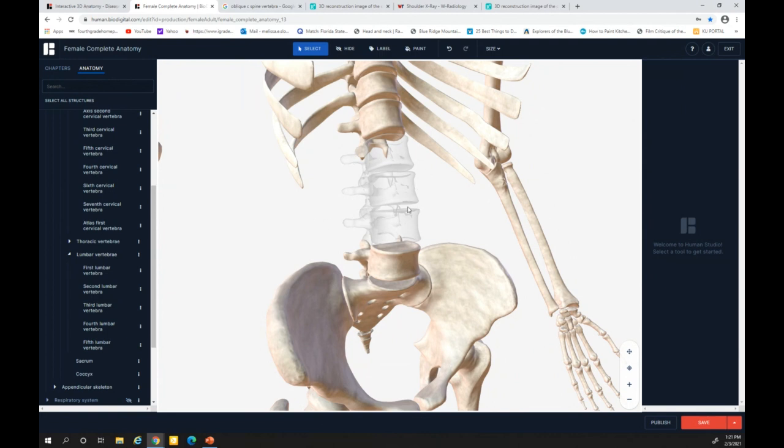But you notice what's of interest is still superimposed over the vertebra. It's kind of superimposed on top of that vertebra, basically. So you'll see the pedicle on the vertebral body itself, and that's going to be the side that's of interest. The dog that's sitting on top of the vertebra is the dog of interest. So that'd be an LPO for the left side.